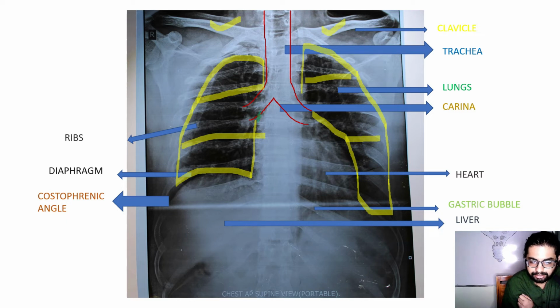And this thing is our heart, sitting above the diaphragm. This is the diaphragm. So above the diaphragm, heart is present.